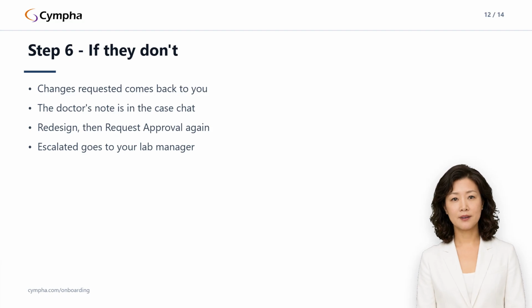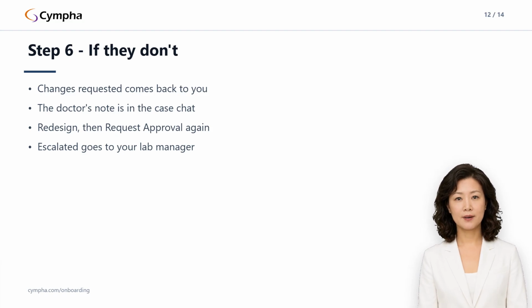If the doctor requests changes, the case returns to you as changes requested with their note in the chat. Redesign and request approval again. The loop is the same one you have already done.